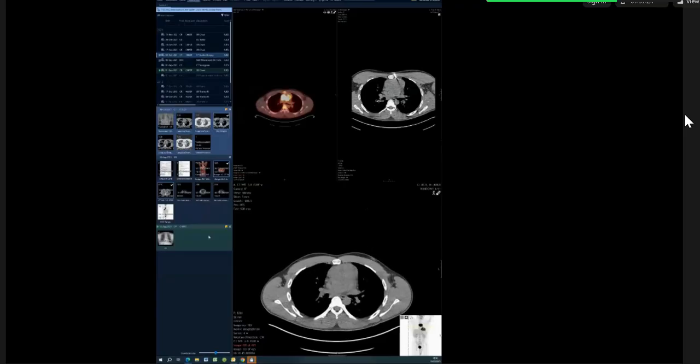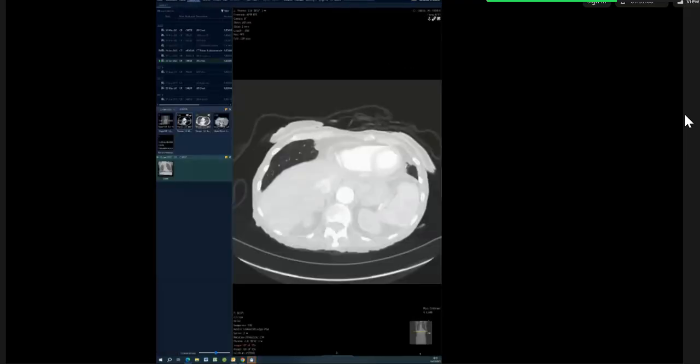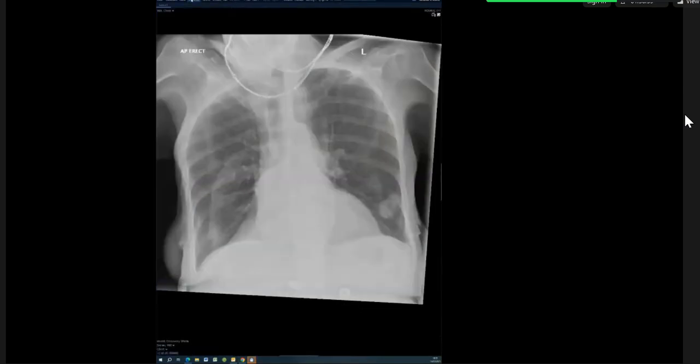Okay. So let's go back. Let's do this one first because we're fresh on it. Do you mind me asking if you work in the NHS in the UK? Yeah, I do work in the NHS. Okay. So let me bring up the first one, and I'll pretend I'm you. So I'm trying to figure out the X-ray while I'm doing it. And I'll tell you how to approach it as you're thinking, because that's the first problem we have: straight away we don't know what it is, and we're thinking and speaking at the same time because we don't want that awkward silence.